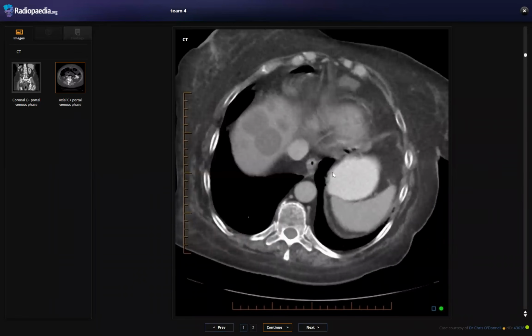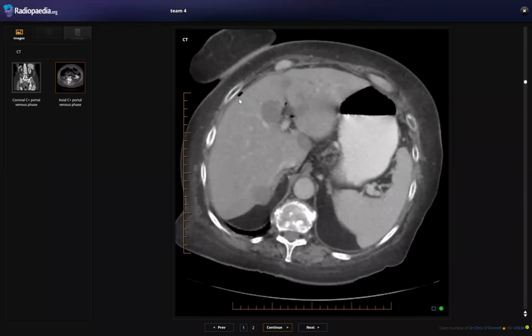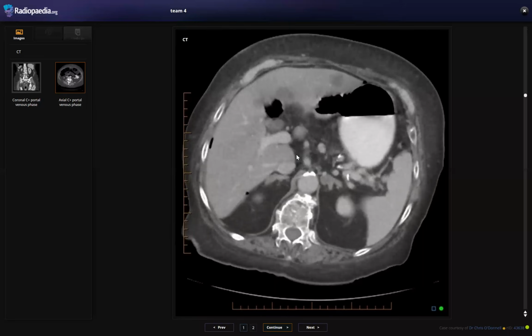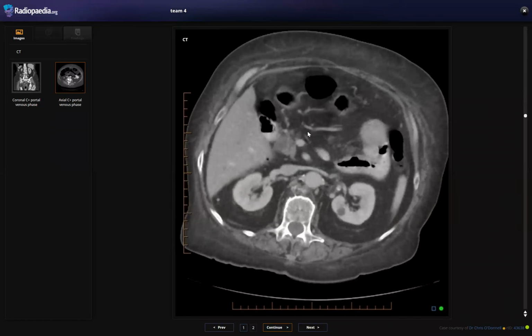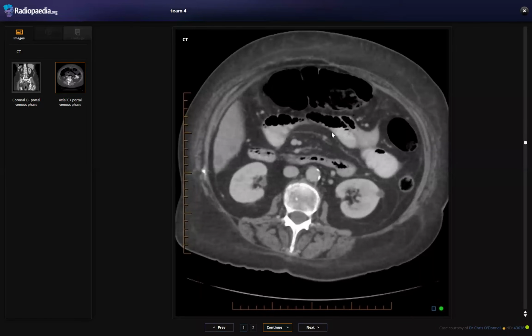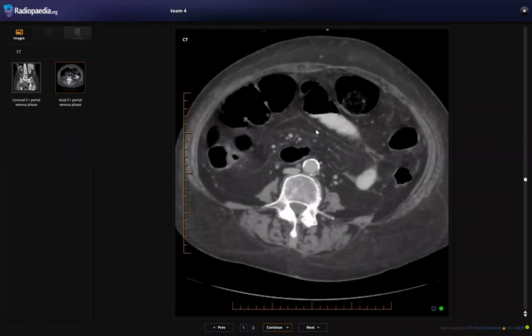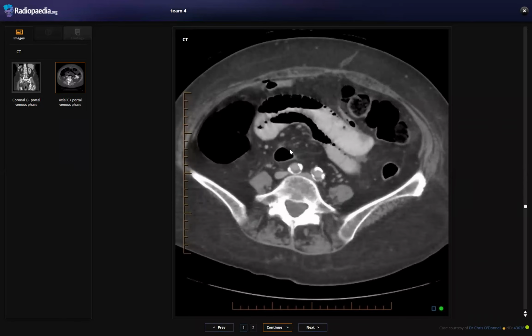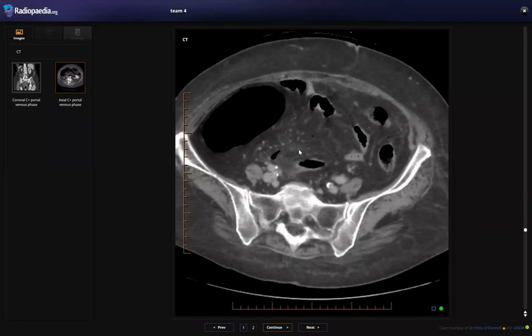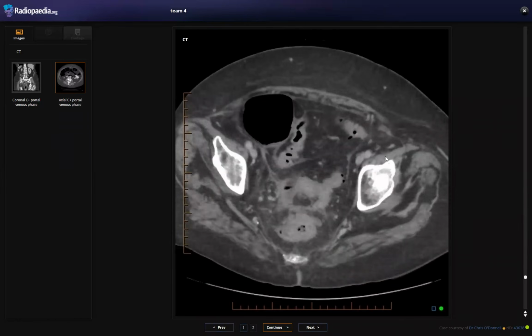Gallbladder is not seen. There is evidence also of intraperitoneal foci of air, which may represent rupture of some of the bowel loops. There is evidence of dilated colon. The colon is markedly dilated, and on the descending colon there is some evidence of loss of haustra.